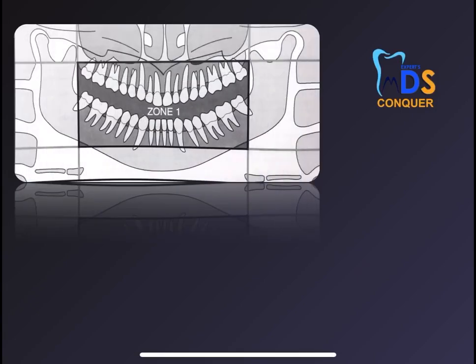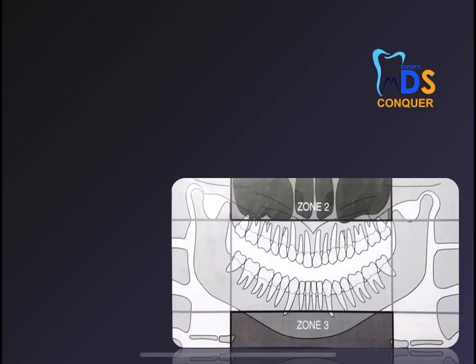So how do you first interpret an OPG image? First you have to look at zone 1, which includes all the teeth. Next, zone 2, which includes the maxillary sinus and the nasal septum, and zone 3, which includes the anterior surface of the mandible.